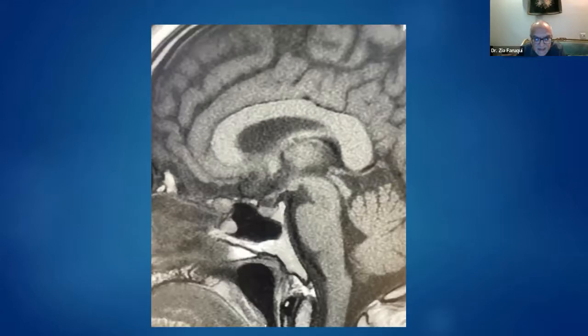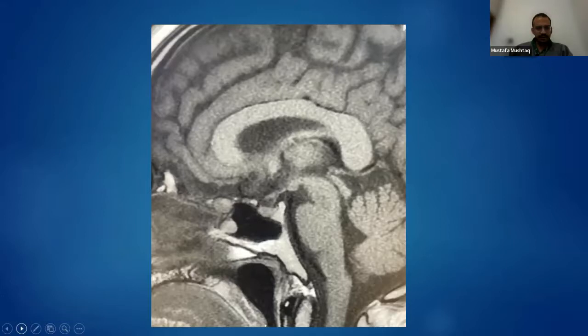Or there's one other abnormality. If anybody can pick it up, otherwise I'll give you a history which will help you to pick it up. So it's basically planum is missing, I think. What is missing? नहीं, ये तो आपने बता दिया ना, ये तो herniation आ गई. इसके there's other. So there's one other abnormality. Well, there are two other abnormalities. अगर आप देख सकते. I think visualize नहीं रही अच्छी orbital plate of frontal bone जो है. उसको आप छोड़ दो, वो देख लिया हमने.